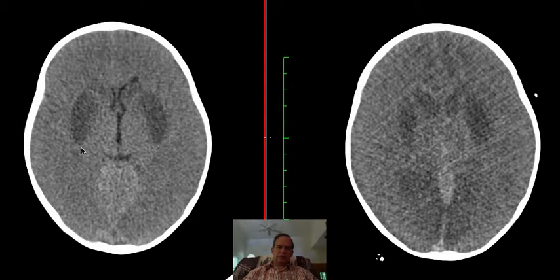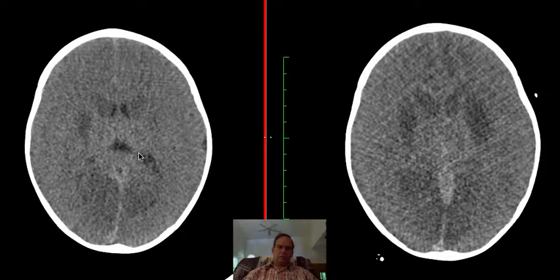Once again, the thalamus does not appear affected.